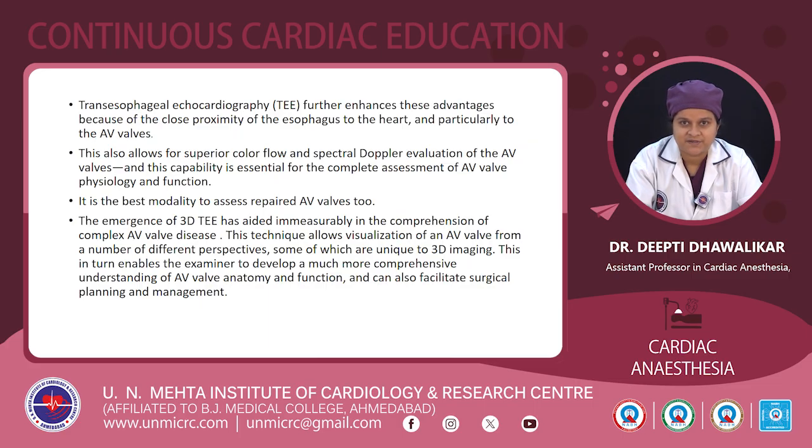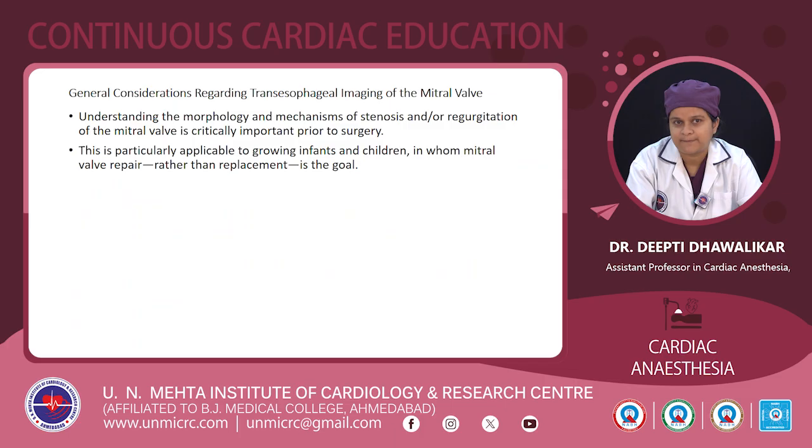This technique allows visualization of an AV valve from a number of different perspectives, some of which are unique to 3D imaging. This in turn enables the examiner to develop a much more comprehensive understanding of the AV valve anatomy and function, and can also facilitate surgical planning and management.